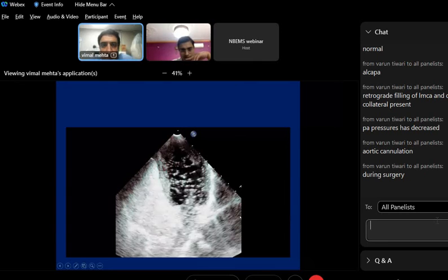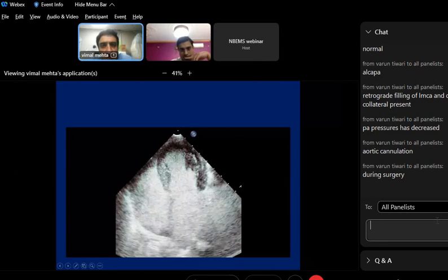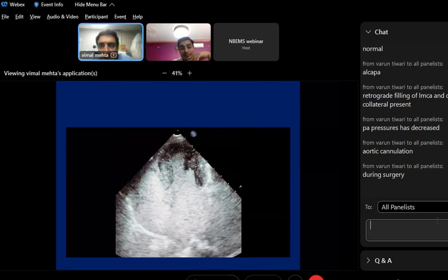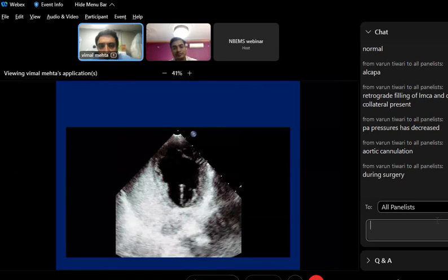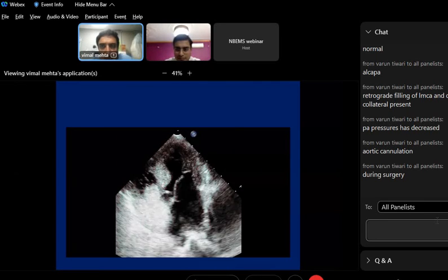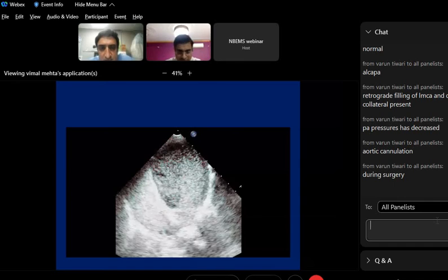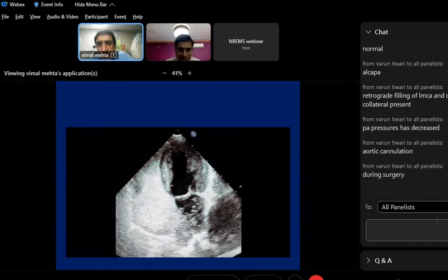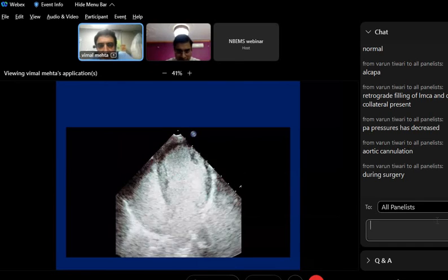So coming over to this one, I got this one, so I thought maybe we'll get it. What is the diagnosis? As a hint, count the number of beats. Quickly, ASD, very good, ASD.